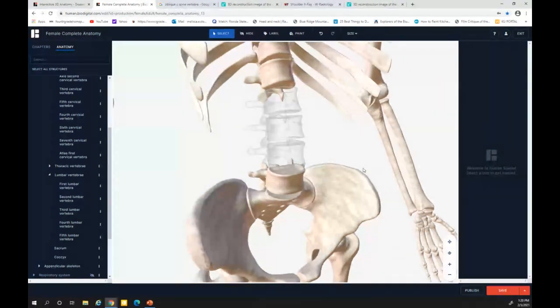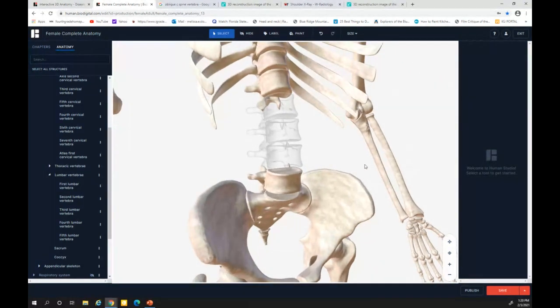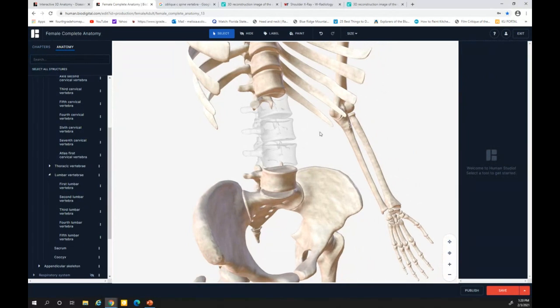Now, what we want to look for, what's of interest, is that zygapophyseal joint, right? So you see this little line right here? That's the zygapophyseal joint. This is the pedicle. And then a little bit of his transverse process, this little bit right here. I'm in the middle vertebra here. So here's this little transverse process, the pedicles in this area. See the zygapophyseal joint here.